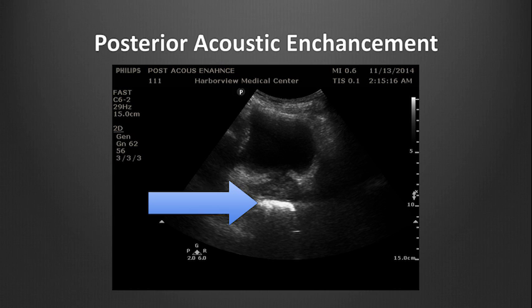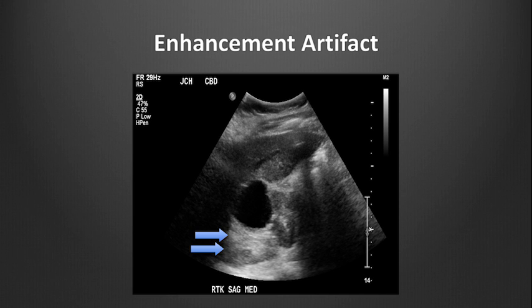In this image, the blue arrow denotes an overgained area deep to the bladder where it may be hard to see fluid. The next image shows the same area with the gain reduced, and a better visualization of the underlying tissue. Again, here is an example of acoustic enhancement showing the artificially hyperechoic or bright appearance of tissue deep to a fluid-filled structure such as this renal cyst.